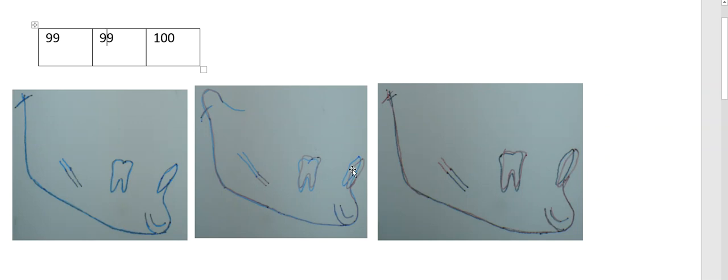There is an increased distance between mid-treatment to post-treatment lower incisors, than pre-treatment to post-treatment. So these two things should correlate, because the distance should be equal, because here we are correlating it and it's an adult patient. So this is a mistake.